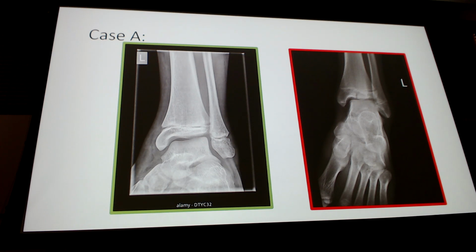The green is the normal. Now I'm giving you another picture to compare, give you a little bit to look at it. At this point, I'm trying to help you know where you're at, so now you can compare what you thought you saw with what normal is. Build that confidence a little bit.